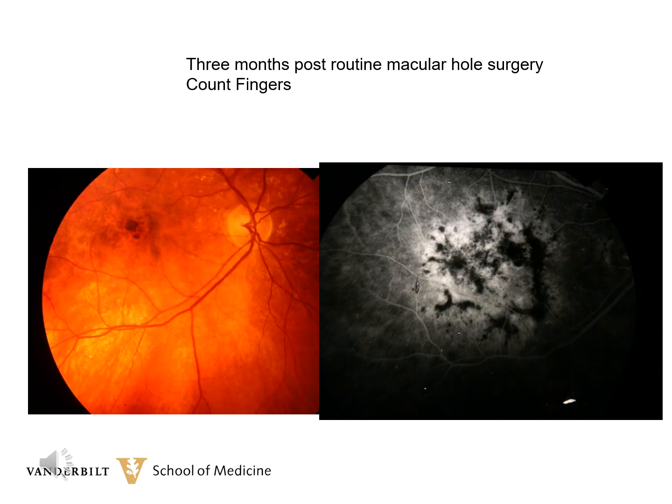This patient had a very routine surgery for a macular hole. There's nothing unusual during the surgery. However, he suffered photic burns. This happened before we changed the wavelength on our light pipes for vitreous surgery. You can see the hyperfluorescence from loss of the retinal pigment epithelium and hypofluorescence from pigment proliferation as a response to the light injury. As I mentioned, our fiber optic lights have now changed the wavelength so that this particular complication does not occur.